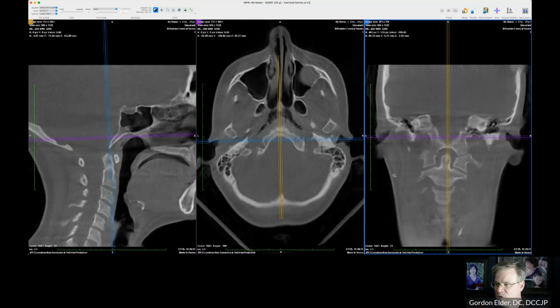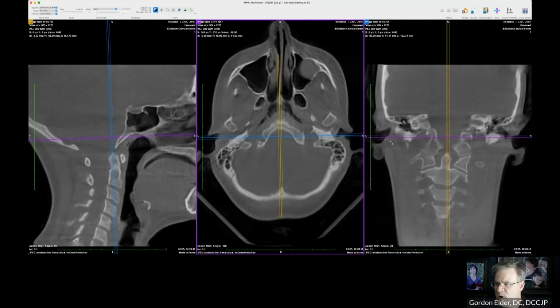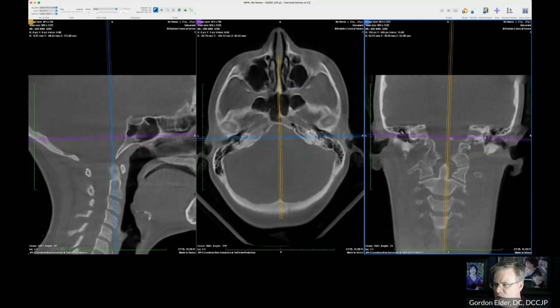Okay, we are going to find those. It's about right there. Bring that up. See, now I'm seeing it better here. I'm going to tilt. Now, I typically will try to find the center of the ear canal on each side, but mostly I want to be balanced with the bottom because that's closest to the foramen magnum.